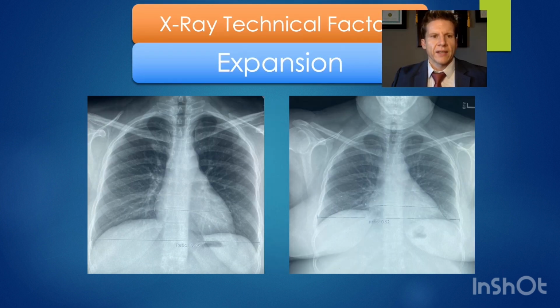Now let's apply some of these technical principles to this patient here. These are two images from the same patient taken one day apart, and these are both PA radiographs.